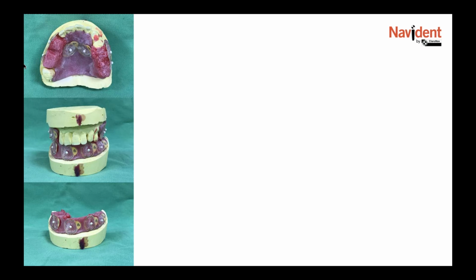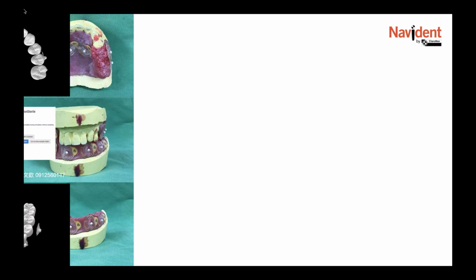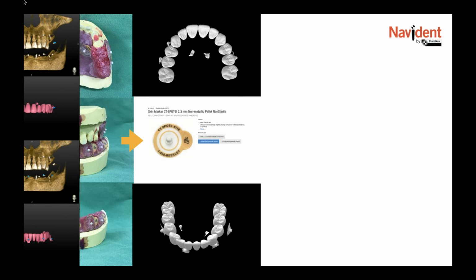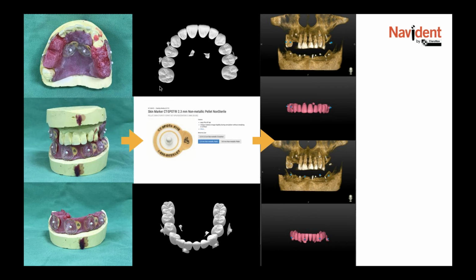Yes, and before I go to the next protocol, I would like to share another one for you. You can see it's a conventional workflow converted to the digital part. For the fully edentulous patient, the first step is to collect the data in the vertical dimensions. So how to collect the data and convert it to digital, and allow the technician to decide in the digital software.